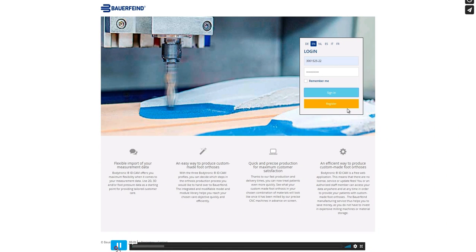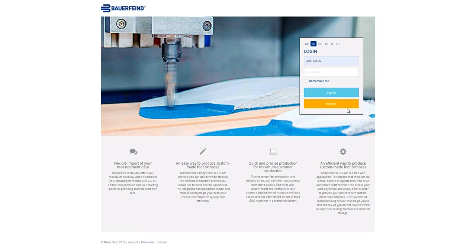Welcome to the Bodytronic ID Cam version 2 tutorial, the web application to configure your individually modeled milled orthoses. In this brief instructional video, we will show you how you can quickly and efficiently get started with version 2 of the Bodytronic ID Cam. You will need an internet connection and Google's Chrome browser.